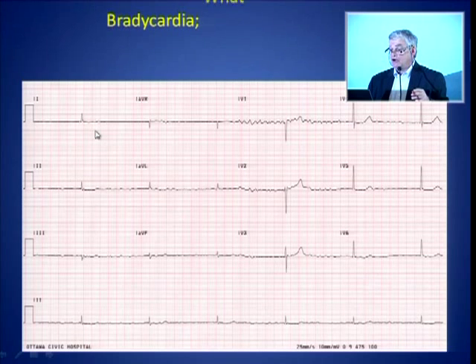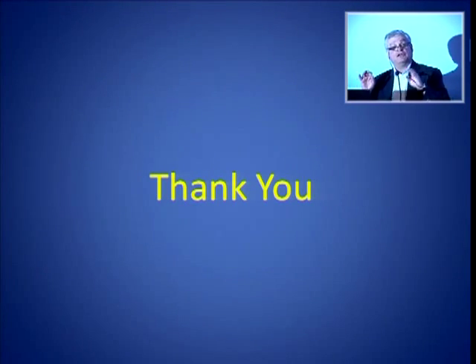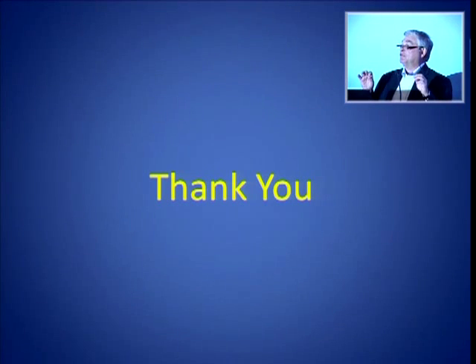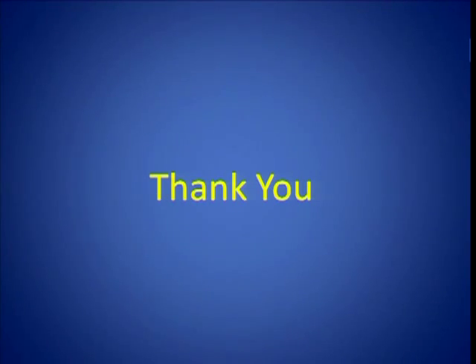So that's all I really wanted to say. The key thing is you have to have a system. You have to look at everything. You have to describe what you see before you make your conclusions. You have to know how to look for a P wave and where to look for it. And I think if you do that, rhythms become not only fun, but you'll find that you're much, much better at making diagnoses.